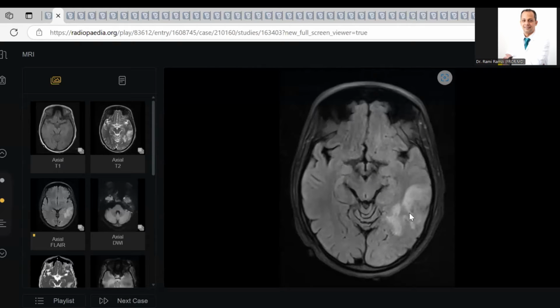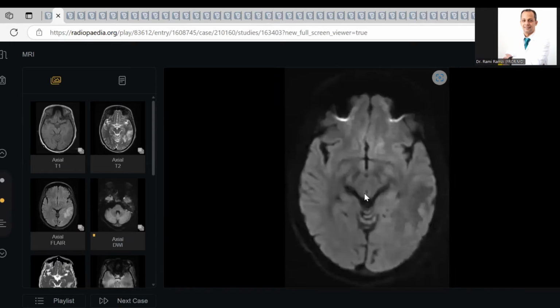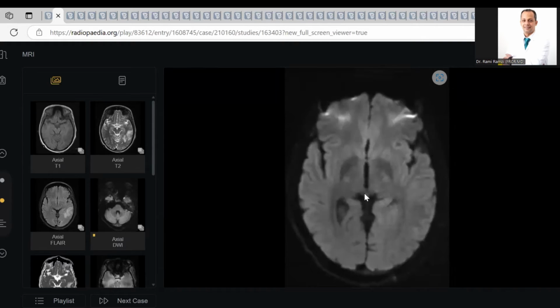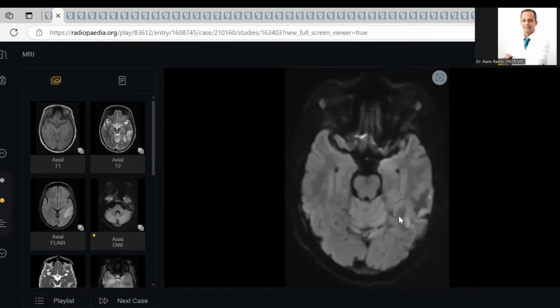So we are suspecting first venous infarction, very classic. Venous infarction is non-territorial, but beside or very near the site of thrombosis. Then here, restriction. Try to think in your speech. You told me this is a restriction. Most encephalitis is not restricted like this.